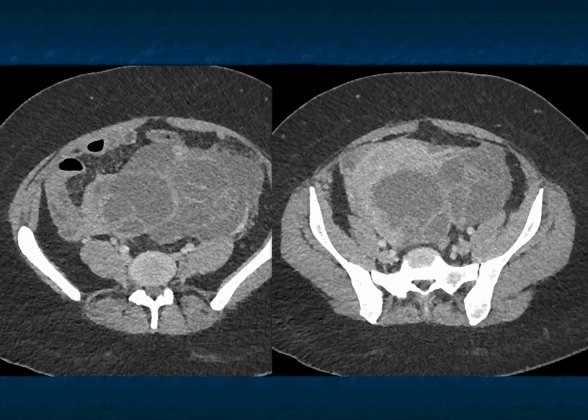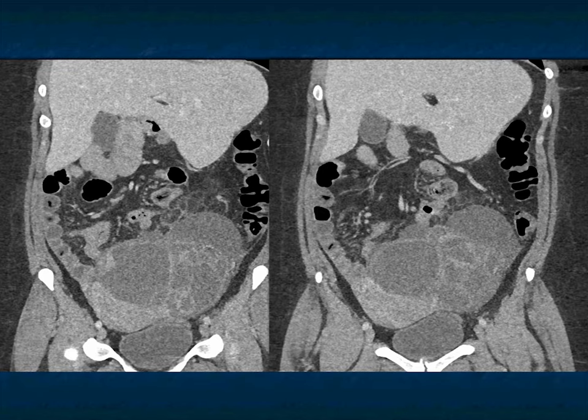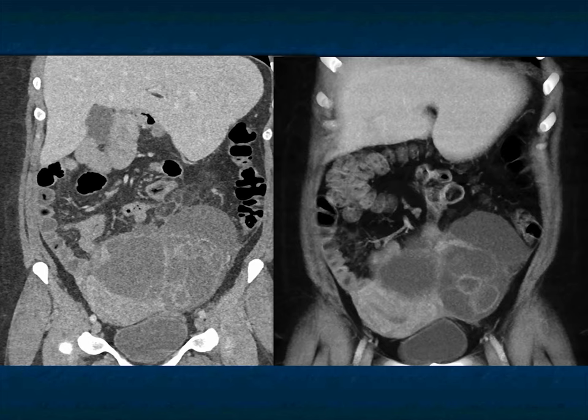Here's some more images down into the pelvis, and you could see I would be thinking about ovarian cancer, ovarian masses, but you can be fooled. This was a really nice example of endometriosis, a really nicely challenging case.